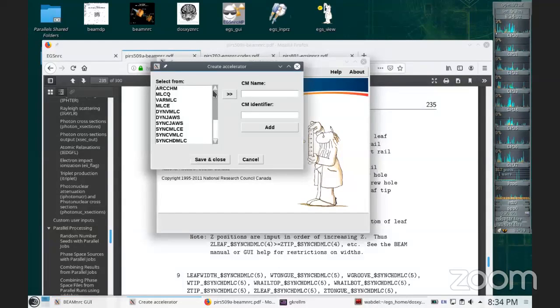So we have to visually divide the accelerator into these component modules, and we're going to put them on top of one another. I'm not talking about the dimensions. I'm not talking about the medium, the materials there. That's in an input file. But just think of what geometries we should use to represent the linear accelerator. So I'm going to do something very simple. I'm going to use the slabs, and I'm going to call that the target.